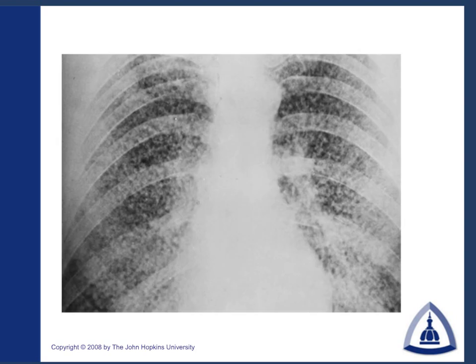This is a second x-ray, looks very similar to that which I showed. Little nodules everywhere. This just happens to be nodular sarcoid. So again, unless we can figure out a way to characterize or classify these infiltrates, there's no way that you're going to make a diagnosis by the chest x-ray.